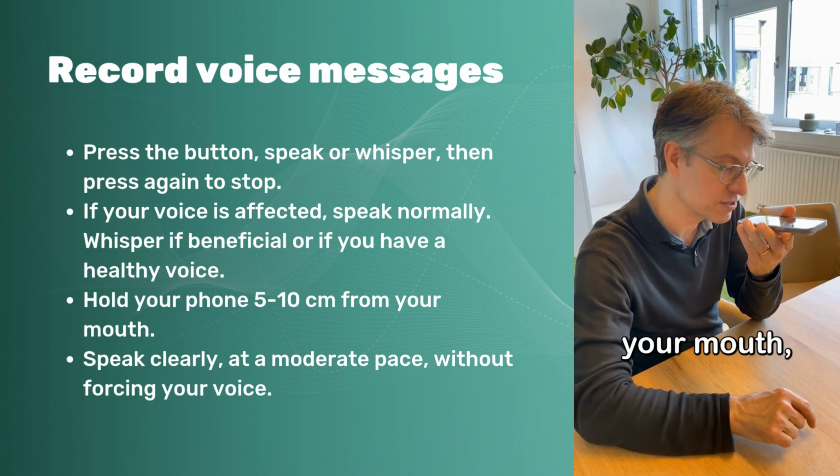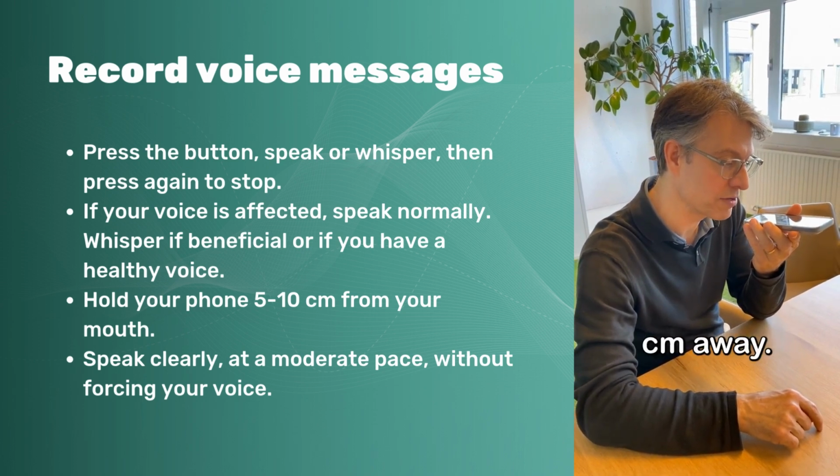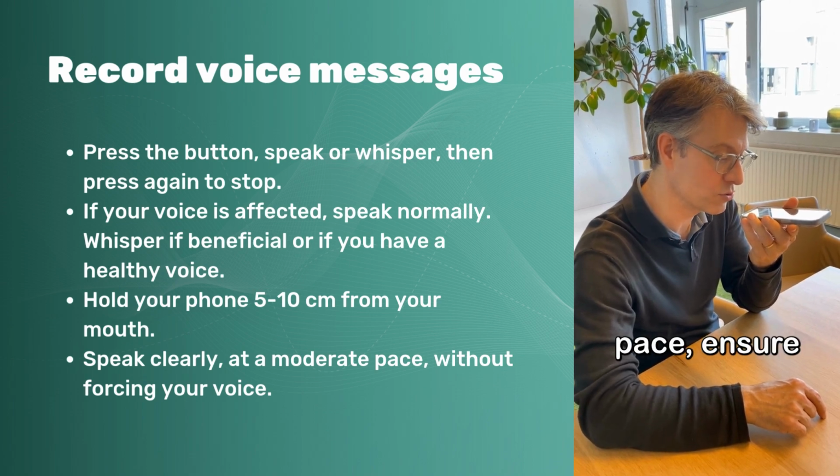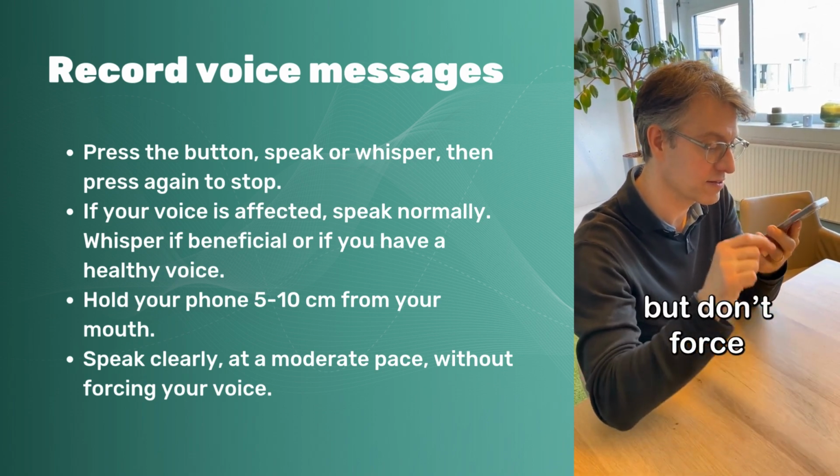Keep your phone close to your mouth, about 5 to 10 centimeters away. Articulate clearly, speak at a moderate pace. Ensure audible speech volume, but don't force your voice.